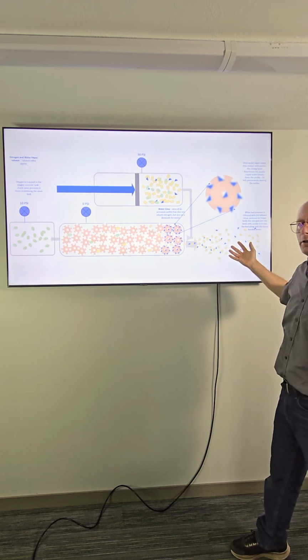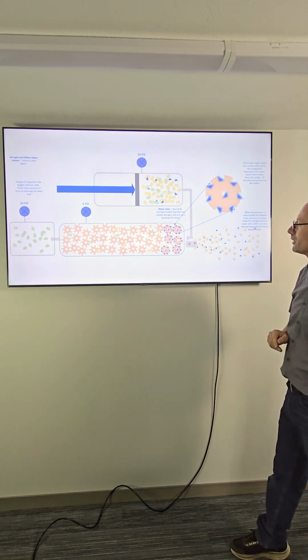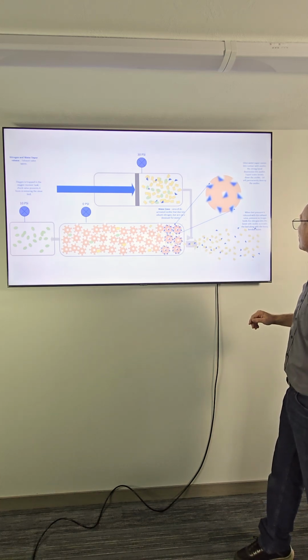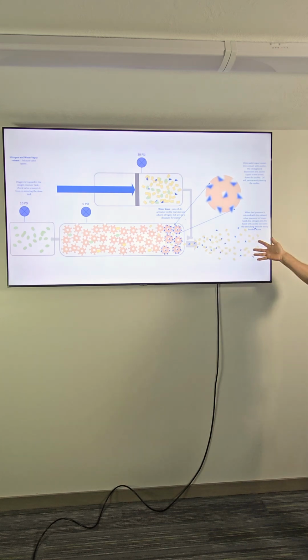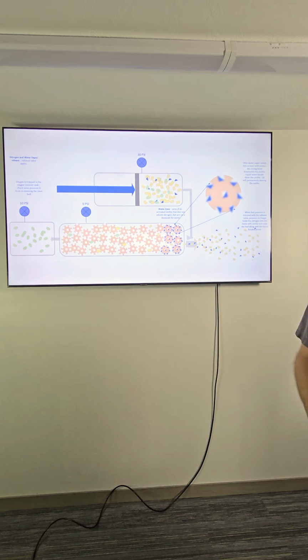So this is getting rid of some of this moisture, and you're left with this zeolite that still has some water vapor stuck to it, but it can serve to absorb some of that water vapor in the next cycle. So we call this exhausting, blowing out the nitrogen and water vapor. Our oxygen is stored here in the receiver tank.